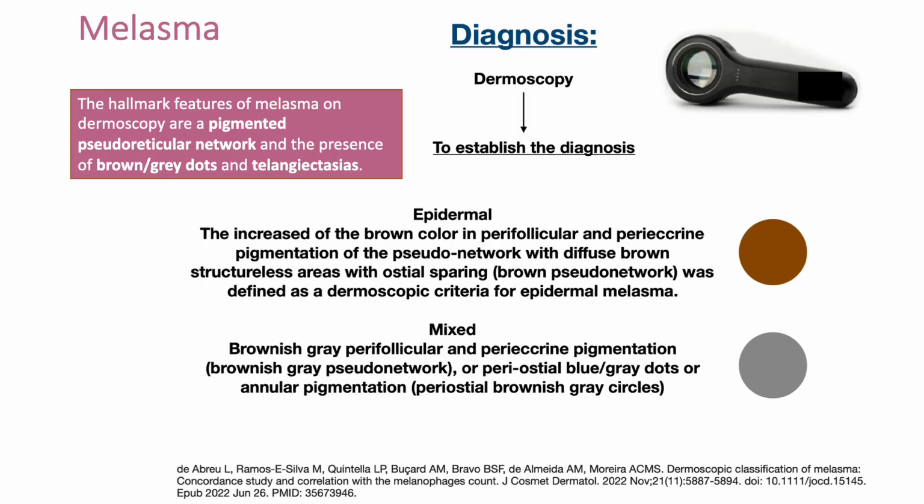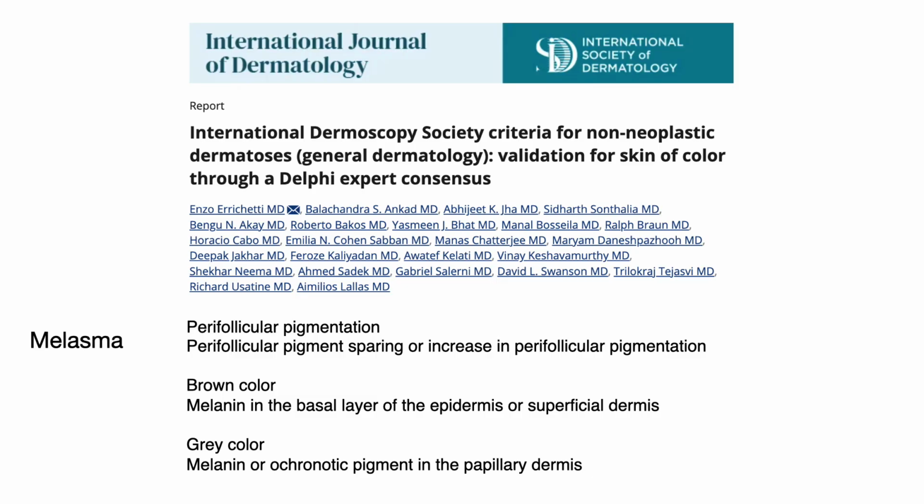And while the epidermal is characterized mainly by the presence of the brown color, the mixed one is represented by the gray color. And the hallmark feature of melasma is the presence of the pseudoreticular network appearing in these two different colors, as mentioned.